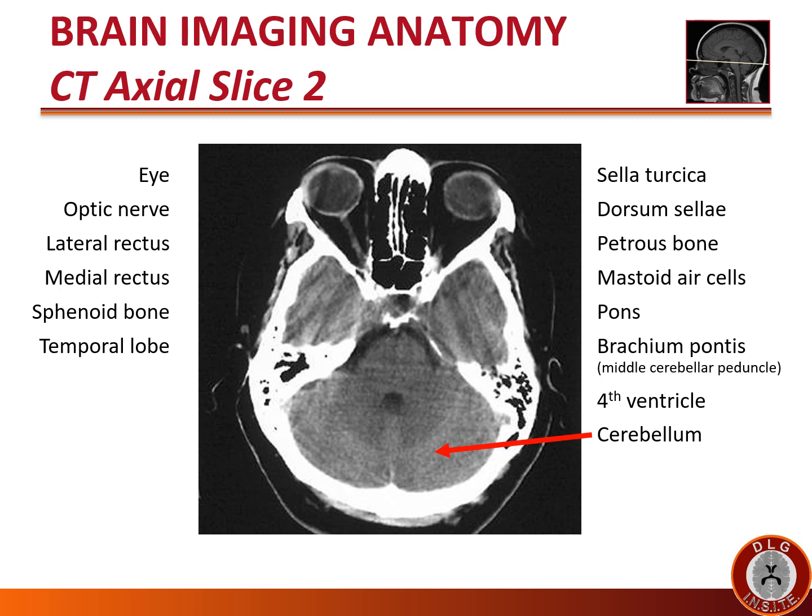The cerebellum lies behind the pons in the posterior fossa. Note that the cerebellum parenchyma goes across the midline. The central part of the cerebellum is called the vermis. There is no fissure or CSF structure in between the two sides of the cerebellum.